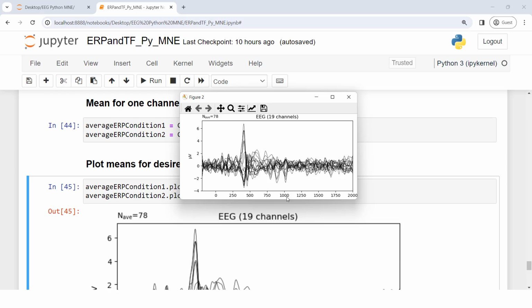Focusing on condition 1 and 2, we've explored the data associated with epochs, ensuring we have a foundation for ERP and time frequency analysis. Specifically, we examined the structure of the data, ensuring that we have distinct averages for conditions, and visualized ERPs for a chosen channel.